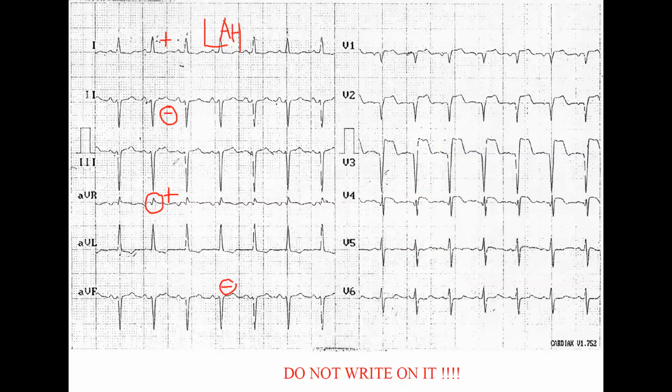Now you can go for the QRS complex. It appears to be normal. The width of the QRS is normal. Don't be surprised if something is normal.